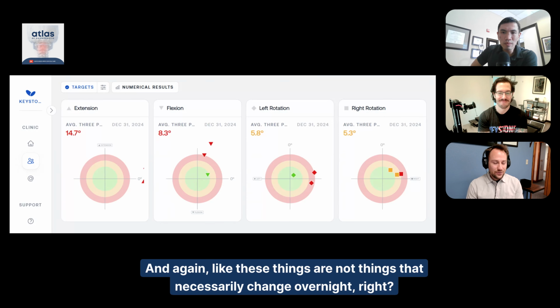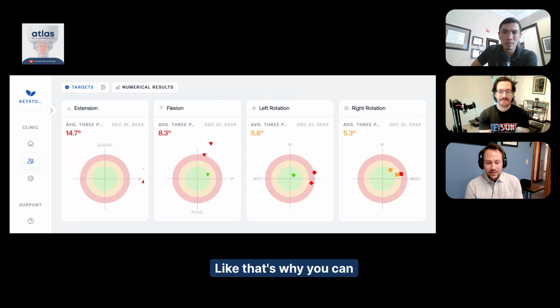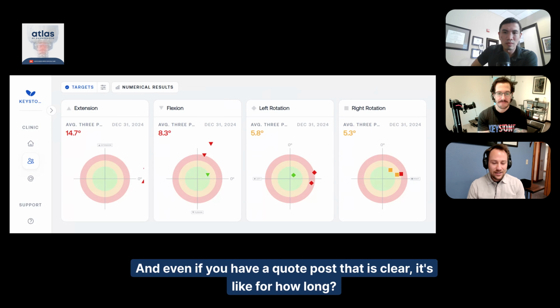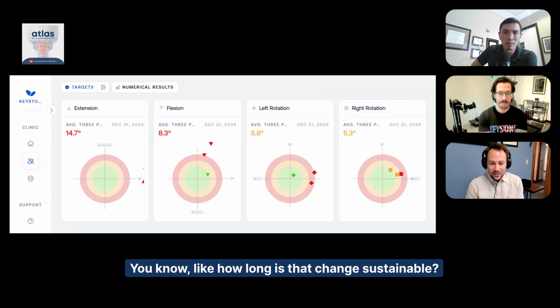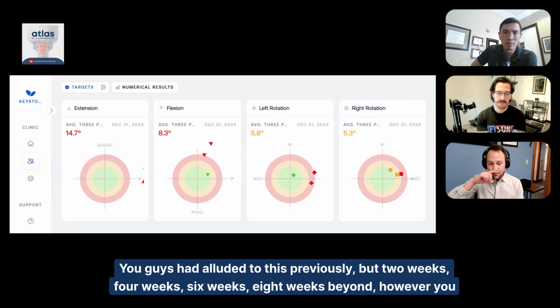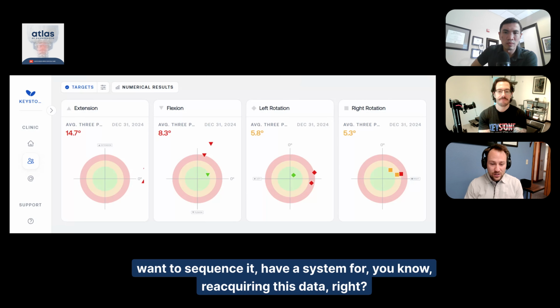And again, these are not things that necessarily change overnight, right? That's why you can pattern it and follow trends over time. Even if you have a quote post that is clear, it's like, for how long? How long is that change sustainable? That's where measuring these things at intervals over time matters. You guys had alluded to this previously, but 2 weeks, 4 weeks, 6 weeks, 8 weeks and beyond, however you want to sequence it, have a system for reacquiring this data, right?